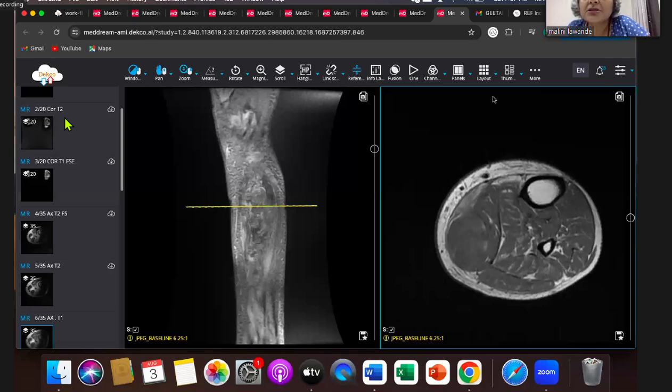Other question is, if you don't see the ganglion, you may not always see it because the extension into the joint may be very thin. But it's a typical location, dorsal scapholunate, the typical locations, so I would still call it a ganglion. And I know it's a cystic lesion. Left posterior chest wall was myositis ossificans.